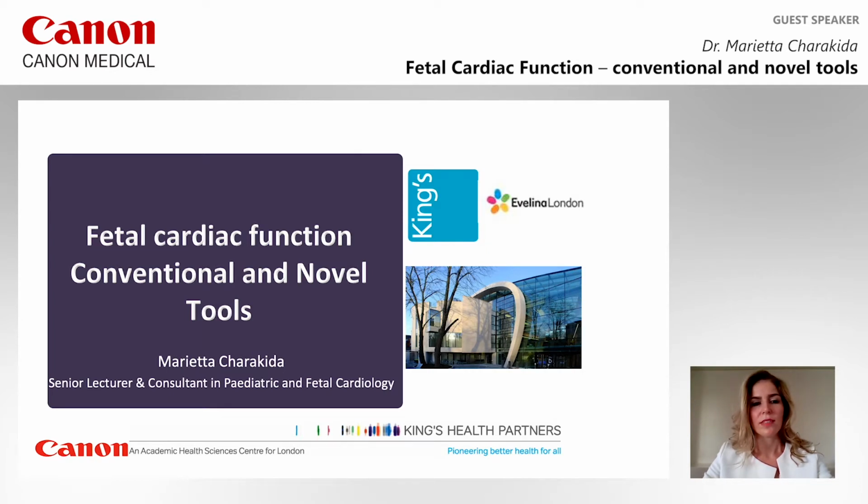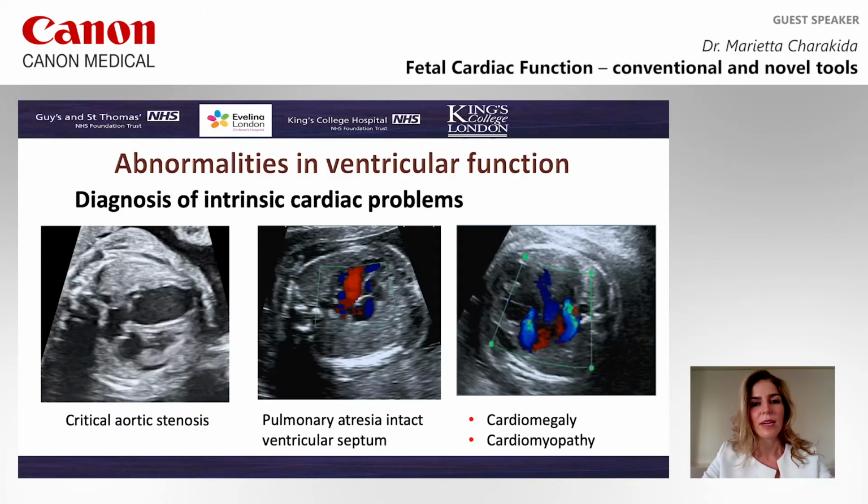Today we are going to discuss fetal cardiac function, and I'm going to give you a brief overview of conventional and novel tools available in the Canon machines. Some abnormalities in ventricular function can be seen with the naked eye.